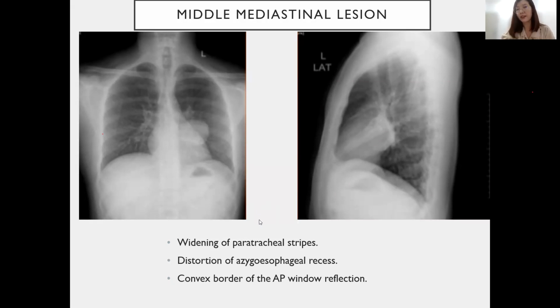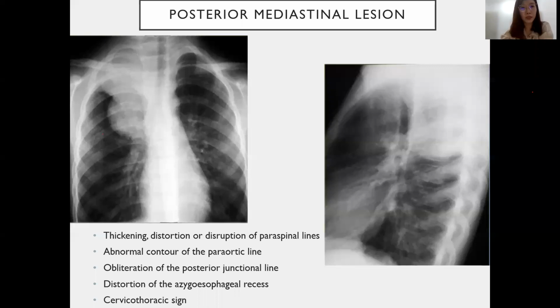But these features are very rarely used to identify a middle mediastinal mass. I will always just say there's a mass here, maybe from the mediastinum or lung, and then always suggest further evaluation.